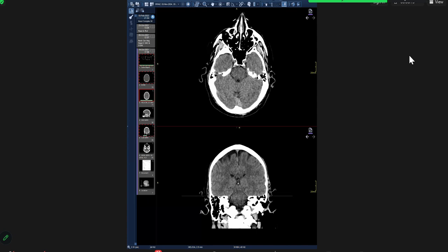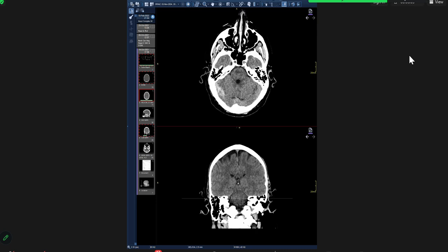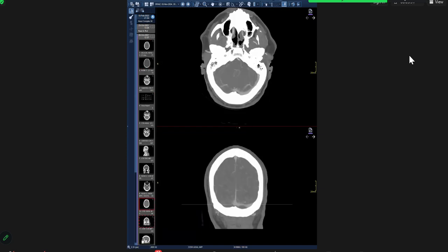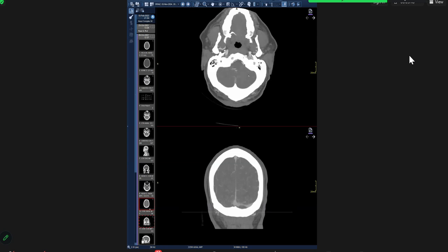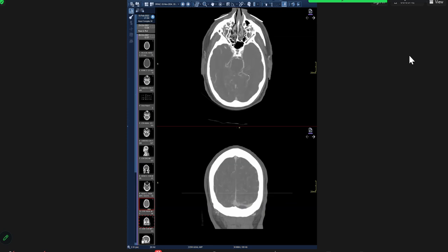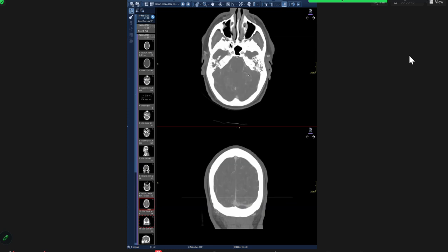So there is a destructive process. I would like to go for MR after the CT. It could be some schwannoma or metastases. Yes, so I will give you the next set of images and you can request. They did a post-contrast study when they saw that. There is non-opacification of the right transverse sinus, likely representing thrombosis of the right transverse sinus.